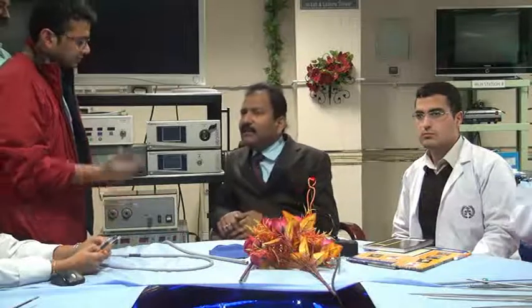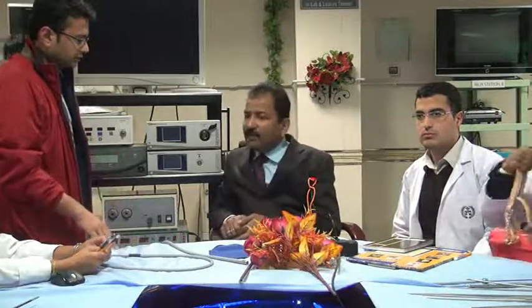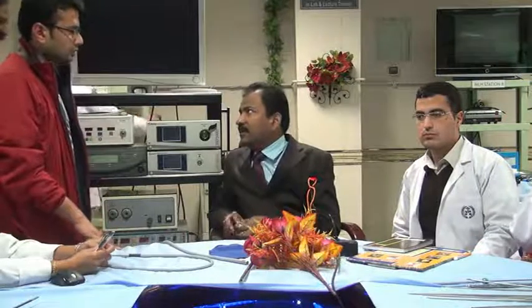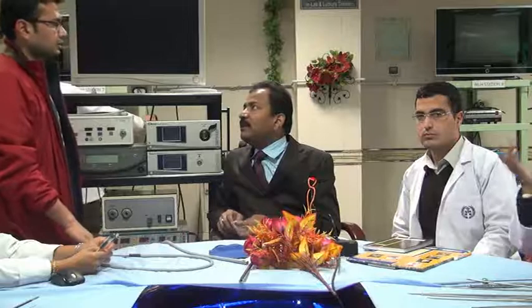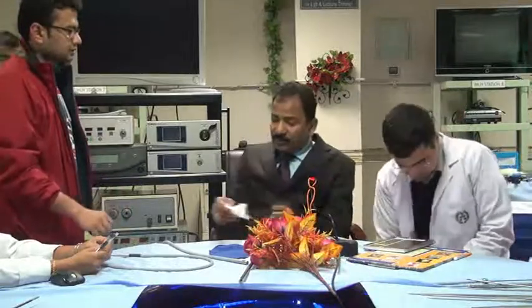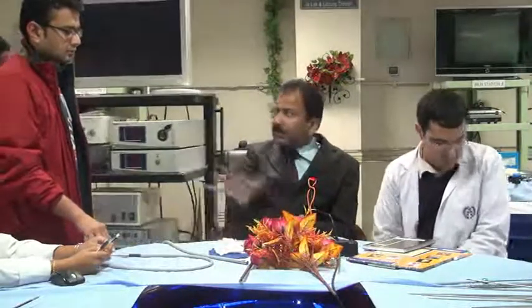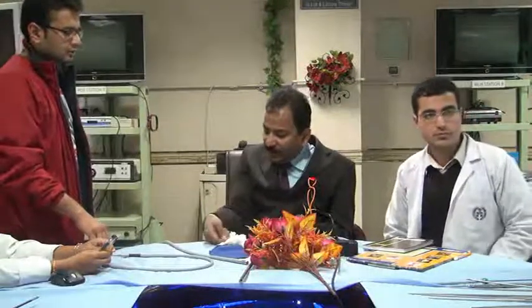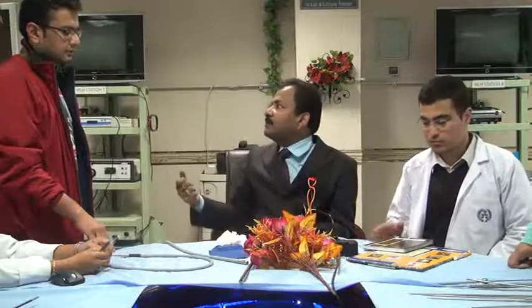White balancing is something different. No, what white balancing will do, it will only remove the impurity. But red, what it will do, it will dominate over the other colors, and it will not allow the others. So suppose there is blood, you see everything red. And inside that bleeding, if there is a lumen of the artery, you cannot appreciate it.